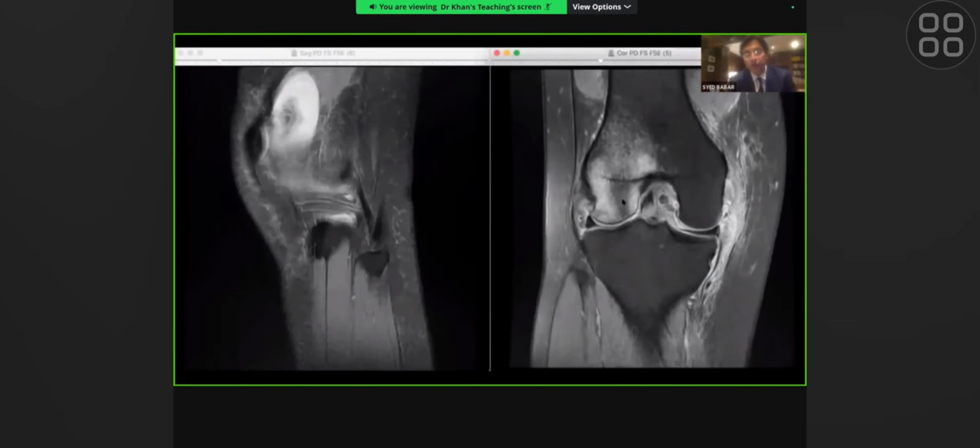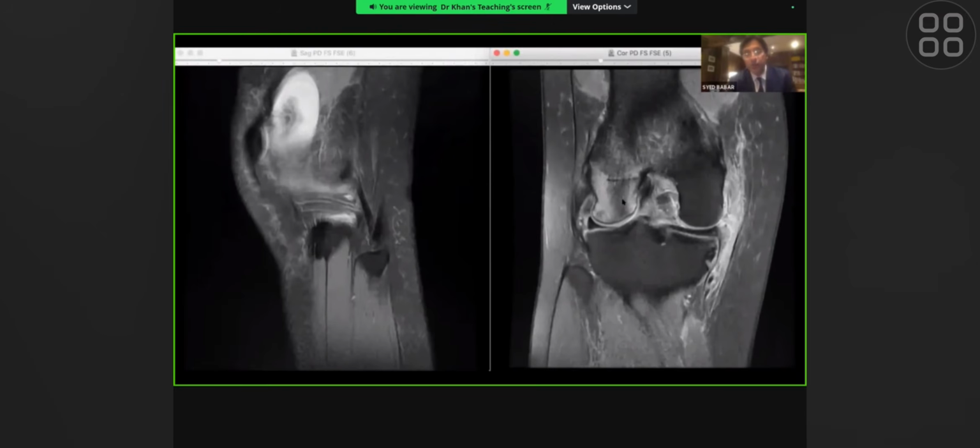Now let's just confirm the lateral before we go anywhere. So this that you were mentioning is a very important point, because remember, you're only seeing part of the attachment here. There's still a little bit at the front that you're not seeing, because remember, it's a curving bone. So you may well be right that there is a little bit of high signal at the femoral attachment, which I wouldn't be surprised. Look at the huge amount of bone marrow edema at the lateral femoral condyle. So the most important thing for you to understand, can I ask you, if it's not a dashboard mechanism, what else could it be? What else could be the mechanism?